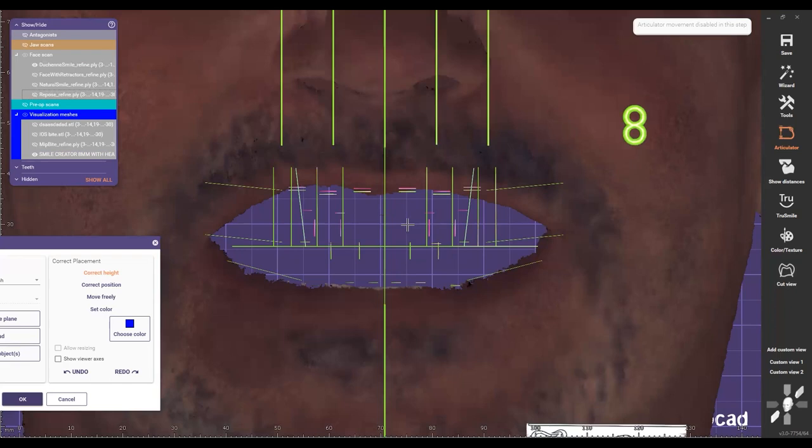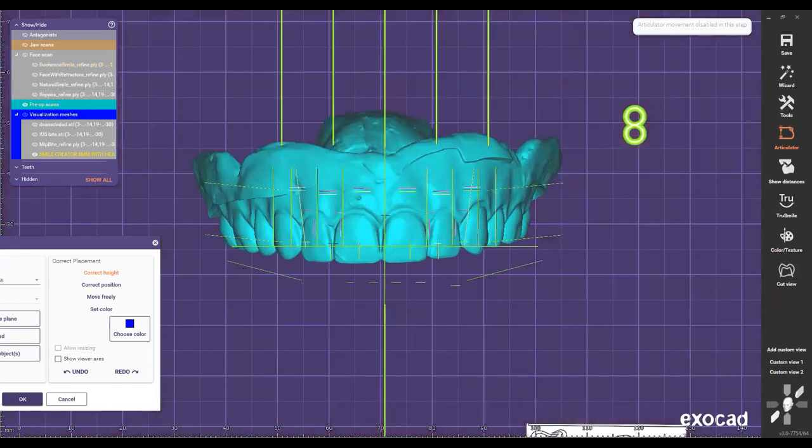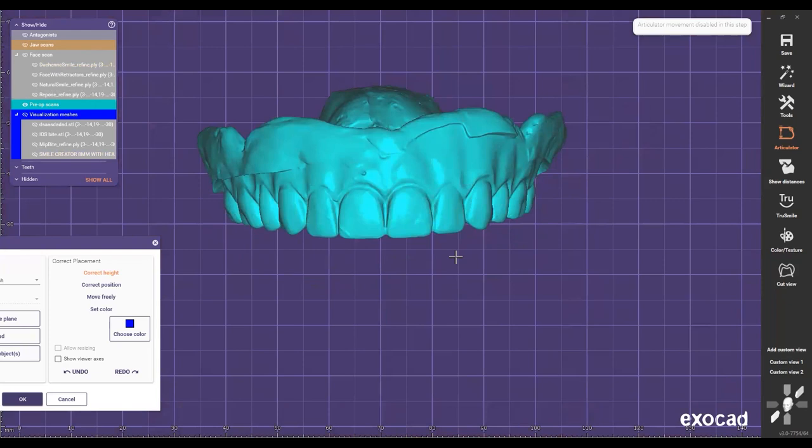And now these cases are fun, because I know what I'm doing, because I learned from my mentor how to do these cases. So now we have this. Because if I don't have the facial scan, this is important to know, and this is what happens in dentistry right now. We just get this denture, and the doctor is gonna say, "Oh, just follow the denture." That's the first thing they're gonna put in the lab slip. And we say okay, let's follow. And then we start putting the teeth following this denture. And then the patient is not happy. The patient says the teeth are too long, and we don't know what's going on.